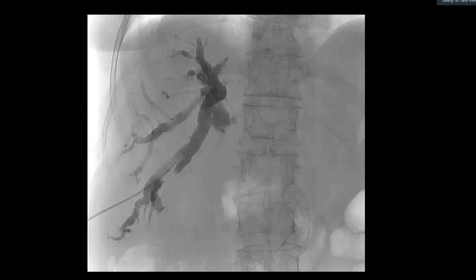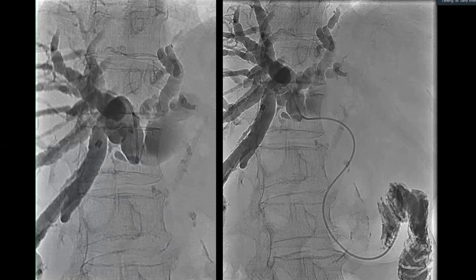Okay. And the other possibility, since it is quite a clear cutoff, not irregular, I think this is likely a benign cutoff. And on the next images, is this of the same patient, sir? Of course it is. Okay. You're doing very well, by the way. Yep. Right. So these are other images.